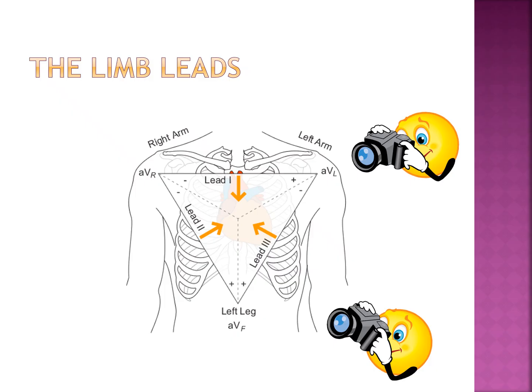The other thing is it could be that there's a defect in the electrical activity. Something is making that electricity reroute and come back the other way. In that case, they probably have a 12-lead EKG that shows that previously. But always, always, always look at AVR first. If it's not a negative deflection, you need to question whether or not those leads were put on correctly, because you got a bad EKG.